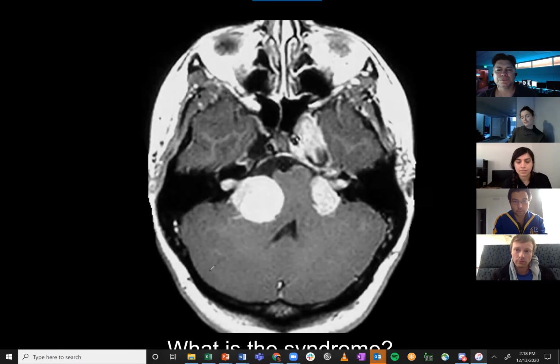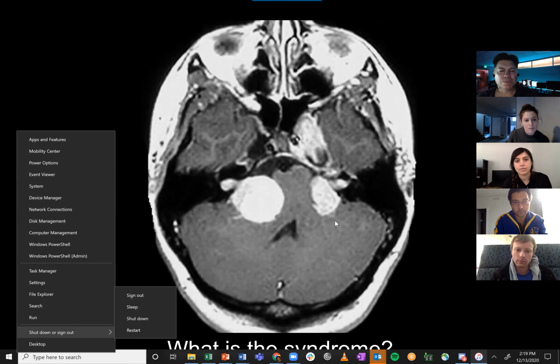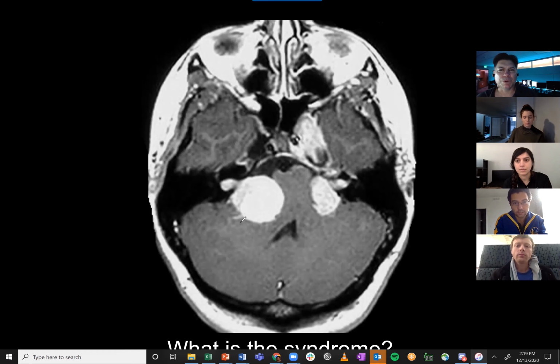So we have on axial contrast enhanced non-fat suppressed MRI two homogeneously enhancing lesions in the bilateral cerebellopontine angle cisterns, extending into the bilateral internal auditory canals, most consistent with bilateral CPA schwannomas. And so I think this person has NF2.